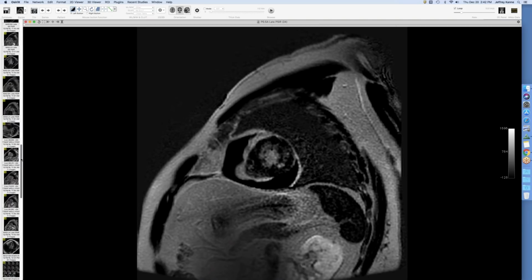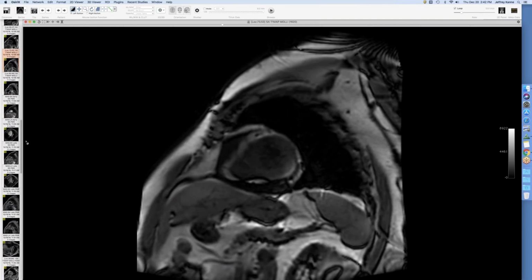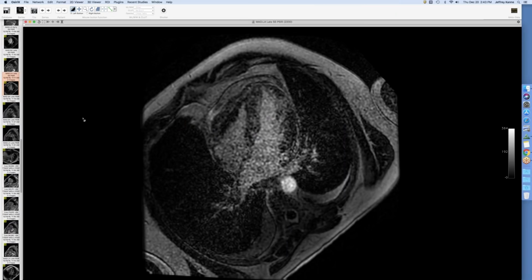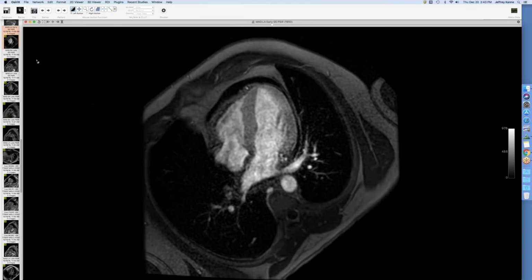So I'm looking for the T1 mapping images here. I think this is it, actually. So we did T1 mapping on this patient, which looks pretty good for eosinophilic myocarditis. So yeah, he's going to get a workup for hypereosinophilic syndrome and see if this is a clonal problem or if this is just something else there. But pretty impressive case. Very interesting.